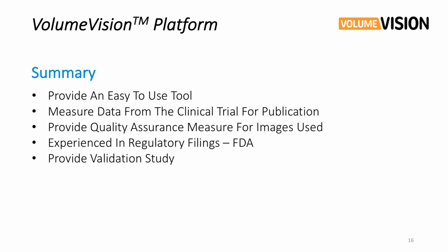So to summarize, what we will provide is an easy-to-use tool which will be fully automated, which will provide data both preoperatively and post-treatment for the clinical trial and for publication, and give a quality assurance measure to show that the images being input are sufficient to do this and have reliable results.